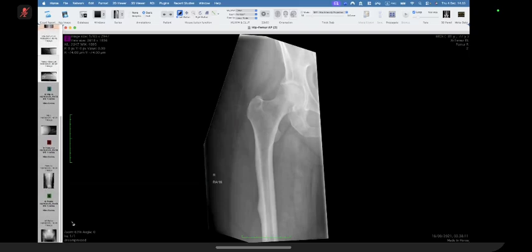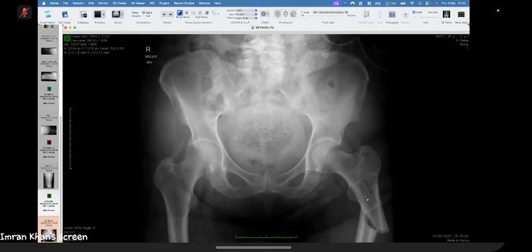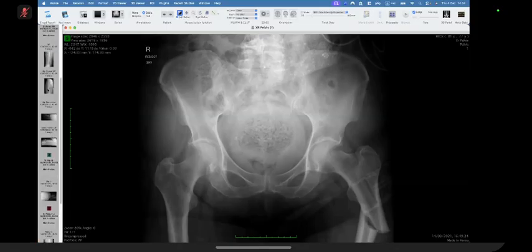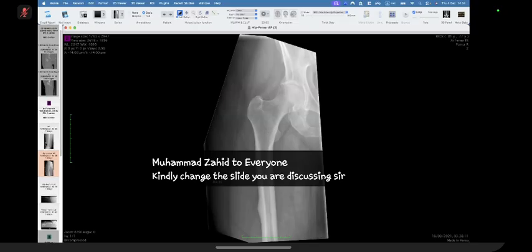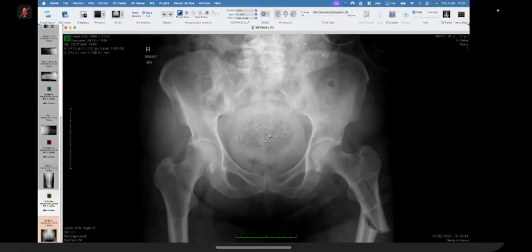They get these fractures in the proximal femur, within 4 or 5 centimeters of the intertrochanteric line. The insufficiency fractures usually start at the lateral margin, which we saw on the other side. And there's literally no specific history of trauma when these patients come in. It's a minor trauma and then the bone goes. So this is a very classic appearance. The bone density looks pretty normal because they're on bisphosphonate, but it is an insufficiency fracture in reality. So this is a bisphosphonate fracture.